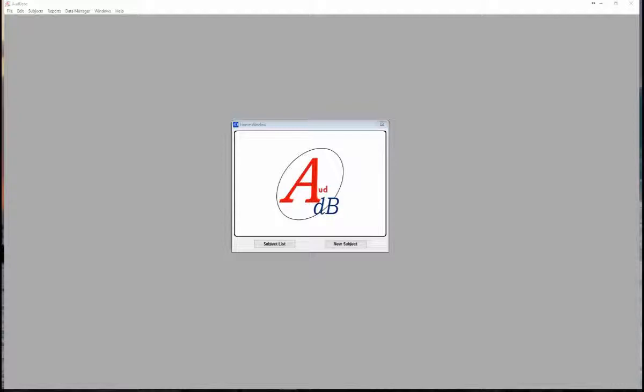The purpose of this video is to give you an introduction to AudBase and how it could improve efficiency of workflow for your clinic. At its core, AudBase is an audiometric database that collects data and stores it to a centralized location. This allows it to be viewed at multiple locations by multiple audiologists.